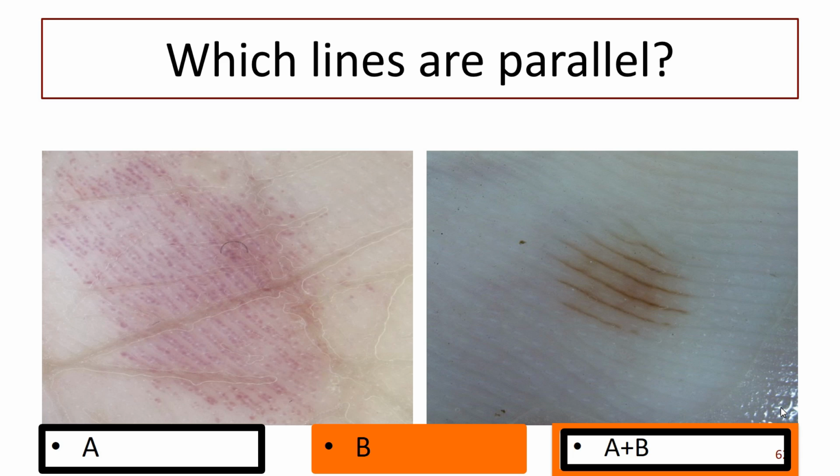So let's have some hands up, or some white and orange tags. Which of these has parallel lines? Okay, most of you. Did you not get 2? We'll get you another one. Difficult to hold up 2 when you've only got 1. Who's next, Emily? Stephanie? Stephanie, which did you see as parallel? B? Okay, and can you describe what you see? Pigmented parallel lines, that's precisely right.